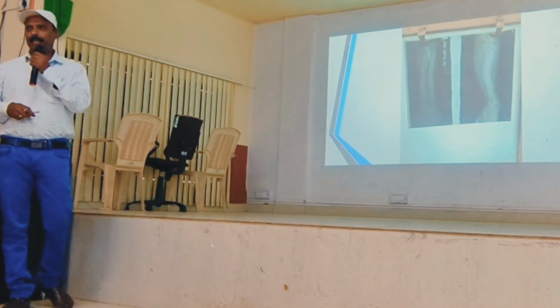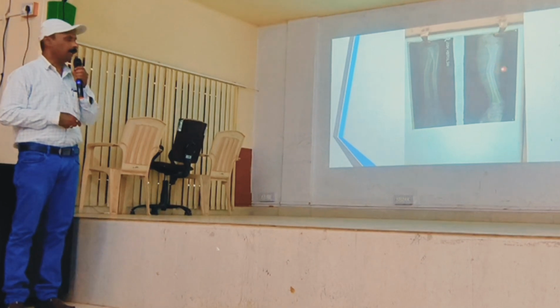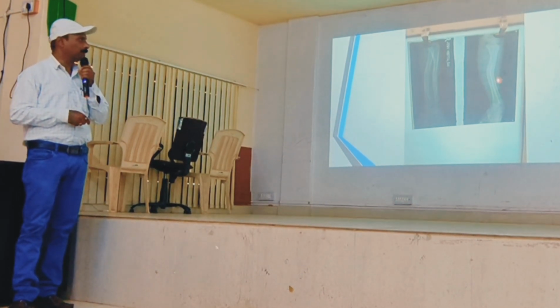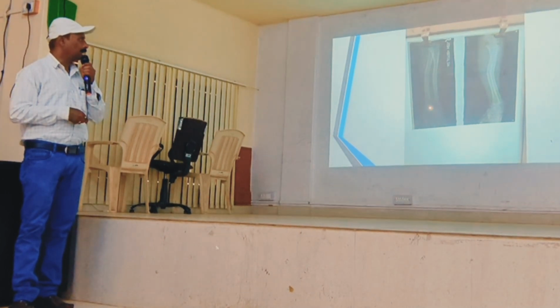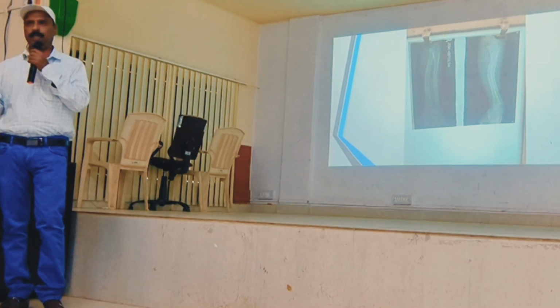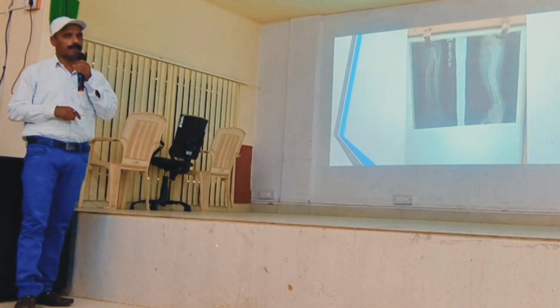In the exam, sometimes the examiner may insist on some pathological or abnormal findings being presented. Here you can see a radius and ulna shaft fracture. In the highlighted area, it is not straight, it is bent. You are going to see the lower end of the radius, and here we have the fracture site. This is an X-ray of the forearm showing fracture of the shaft of the radius and ulna. This is a plain X-ray of the forearm in the AP view and lateral view.